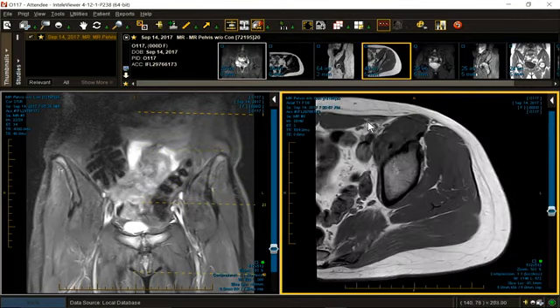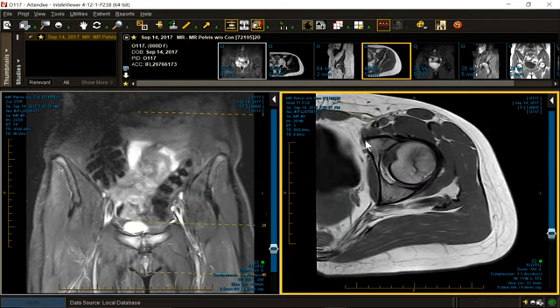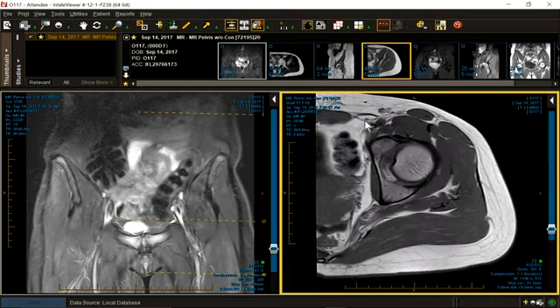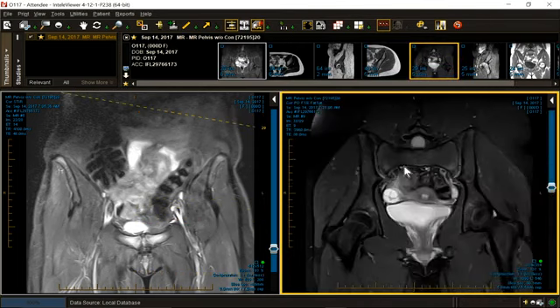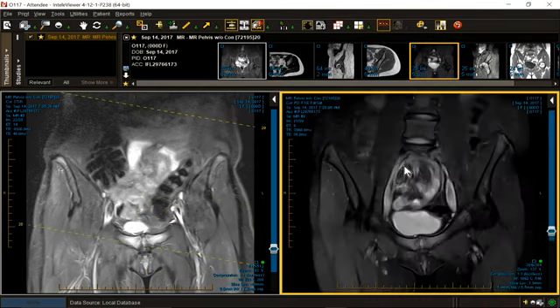I'm interested in looking for defects in the Spigelian line. Fatty infiltration of the anterior musculature. It looks fine. I am interested in the contour of the inguinal canal, the hood, the contents. They look fine. So far, I have not come up with anything that would suggest a soft type of sports hernia.